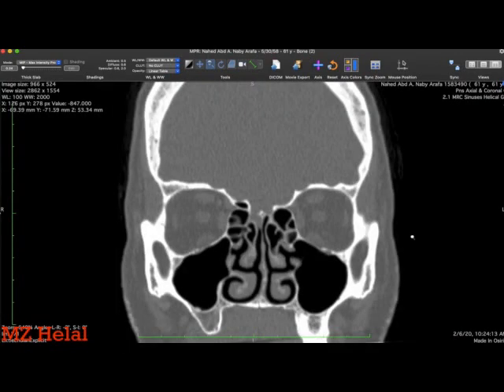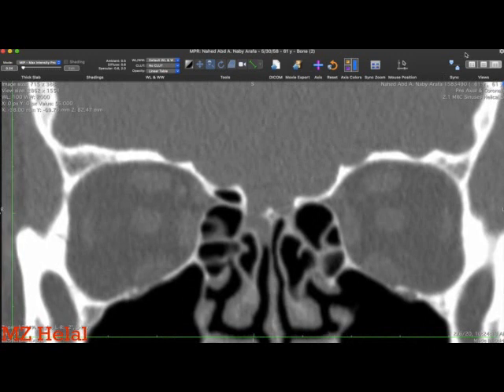If we have these coronal cuts alone and magnify it like this, then this is the defect. We can measure it with precision. It is 2.39 of a millimeter, so 2 millimeter and plus.